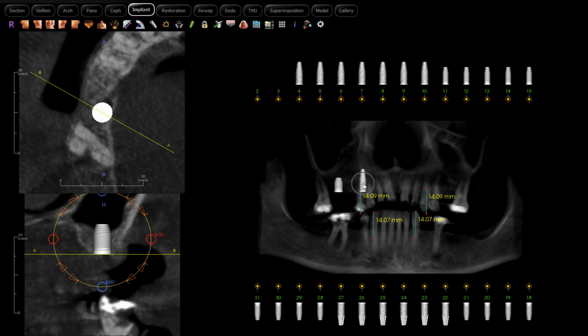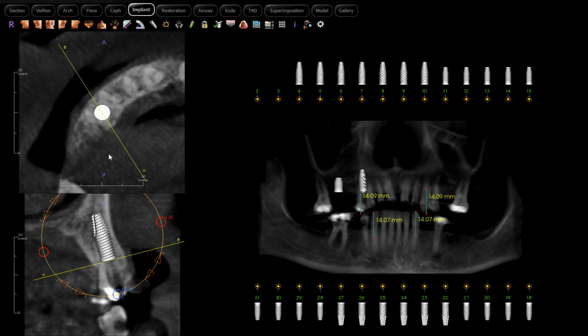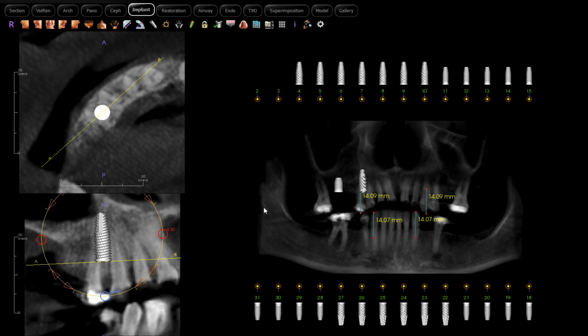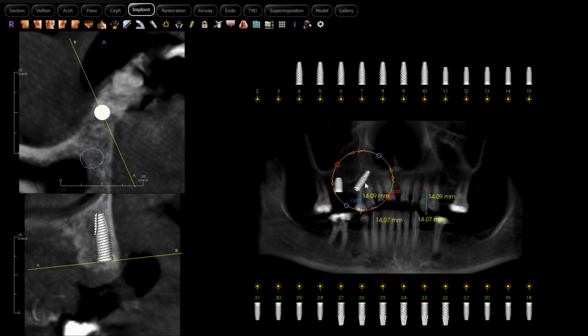So next up, generally if I'm angling implants or doing a traditional all-on-4, I want at least a 4.3x13. That's what we have as the default here. Go ahead and try it in this space, and then as we slide through this slice, you can see we have the sinus there. This is one where it probably does make sense to angle to avoid that sinus, get up in good bone above where our reduction is.